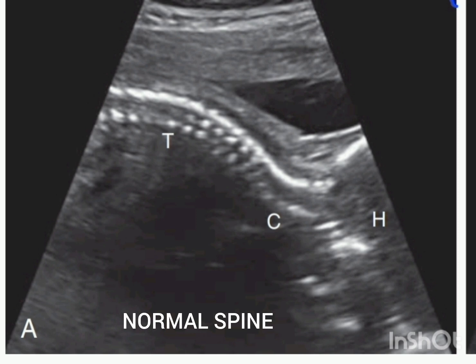It is very important to identify the normal spine in an antenatal ultrasound. In the image above, which is taken from the book Requisites, you can see the normal spine. This is the sagittal image of the spine during the second trimester, and it demonstrates the normal appearance of the spine. You can also note the normal tapering of the sacral spine distally.